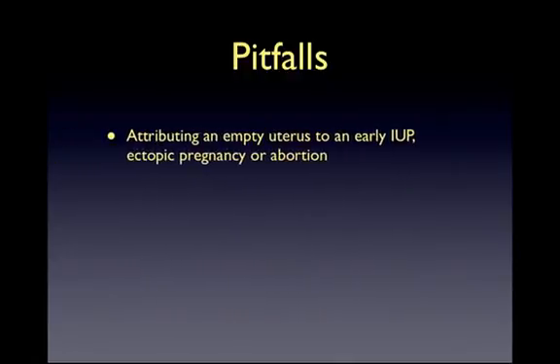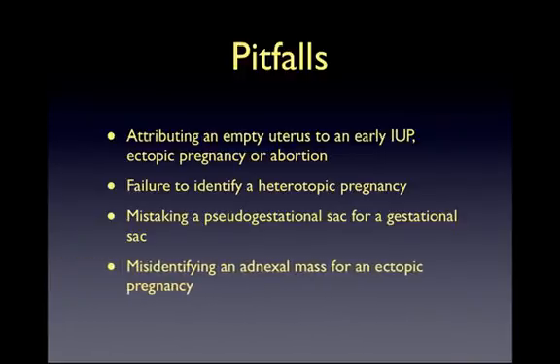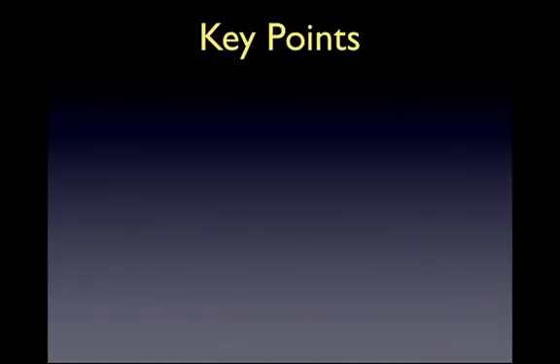Pitfalls to successful interpretation of pelvic ultrasound images include attributing an empty uterus to a very early IUP, an ectopic pregnancy, or a completed spontaneous abortion; failure to identify a heterotopic pregnancy; mistaking a pseudogestational sac for a gestational sac; and misidentifying an adnexal mass for an ectopic pregnancy.